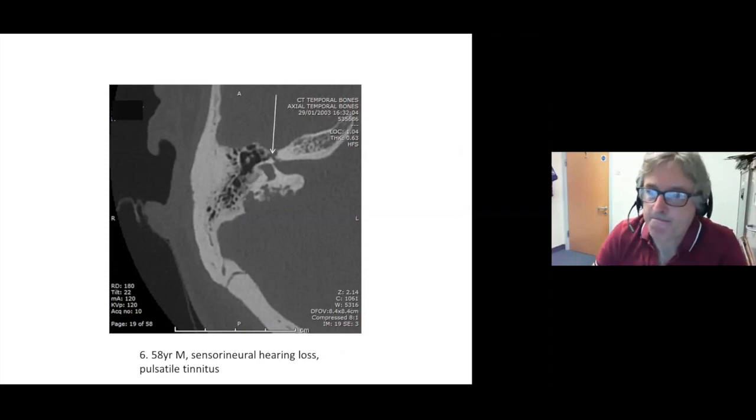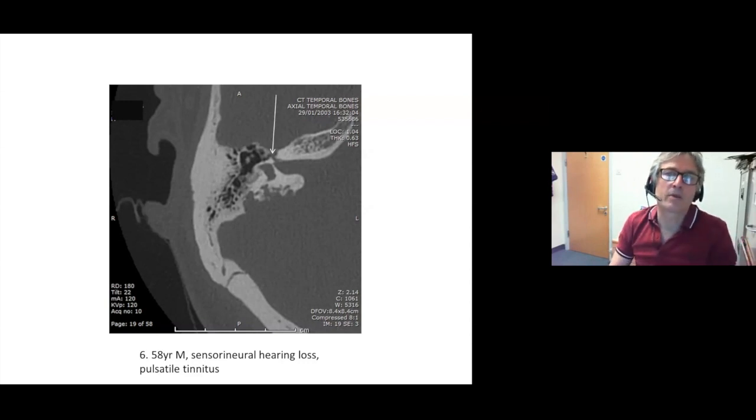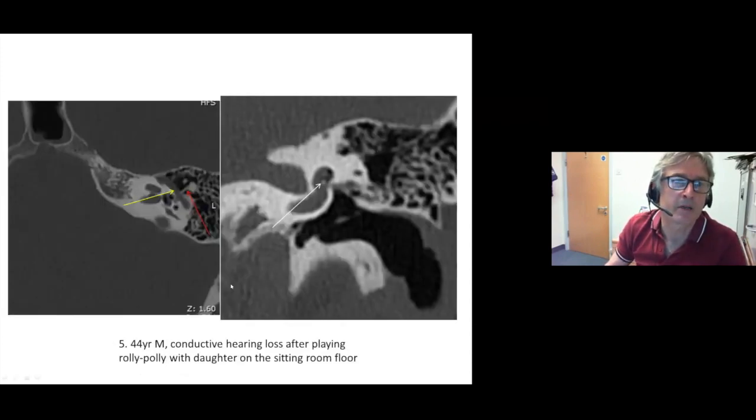Case number 6, diagnosis. Sometimes this is a bilateral condition. And in that situation, what underlying condition would you suspect? So what is the diagnosis? What might be an underlying condition, either unilaterally or particularly bilaterally? And then we've got a normal anatomy pointing to an anatomical structure. And I think I better stop there. I've got a few more, but we'll just go back and quickly whiz through those. Okay, it's just a bit of fun, so don't worry about it.